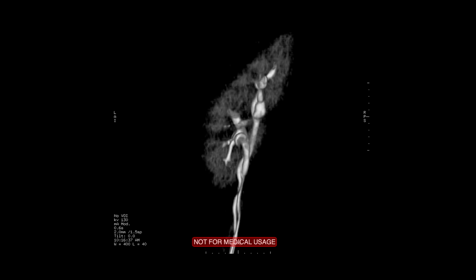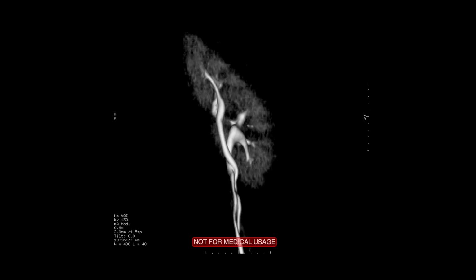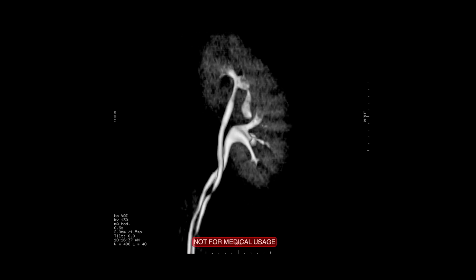The nice thing about these cases is it's a duplex all the way down to the bladder. You can get a very nice reconstructed model here, which shows in this coronal section the duplex system, but also the area where you've got your stones in a calyceal diverticulum. And then you can see very nicely on this image, which is a reconstructed image made by our interventional radiologist, how tight that calyceal neck is, and you can see the cavity that comes off the upper pole of this duplex kidney.